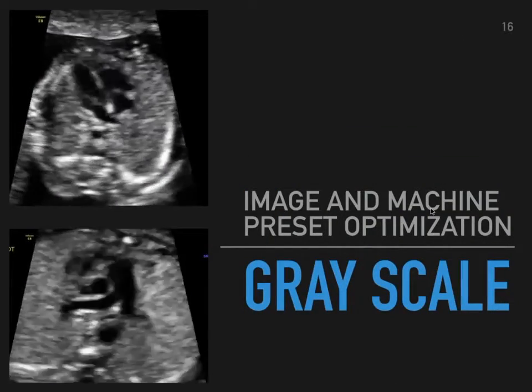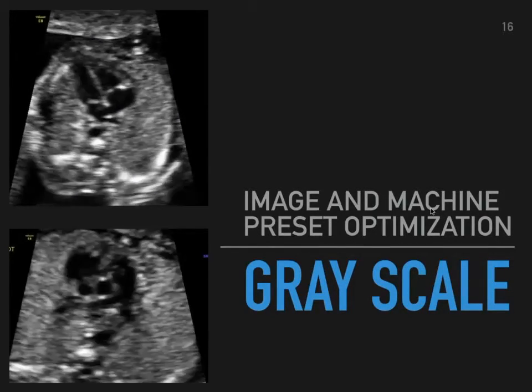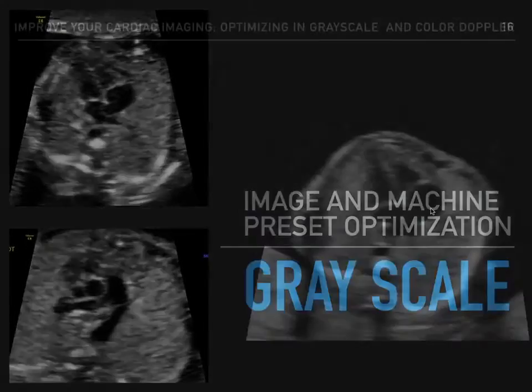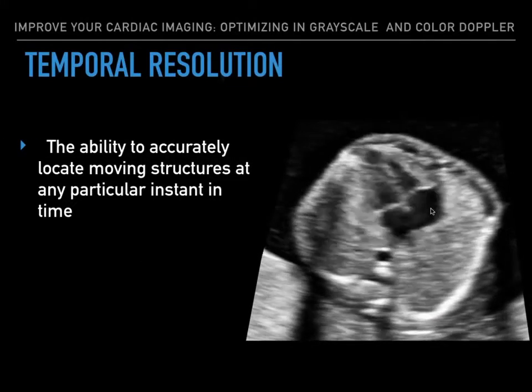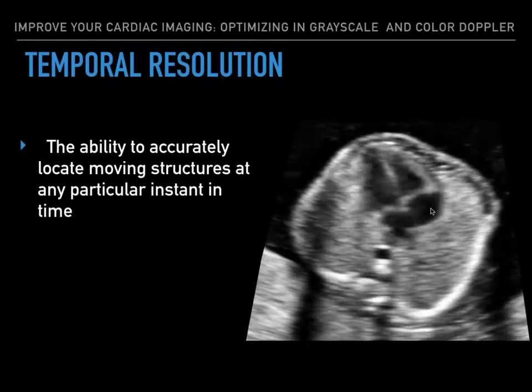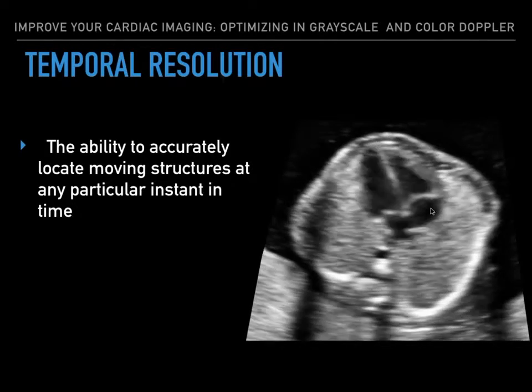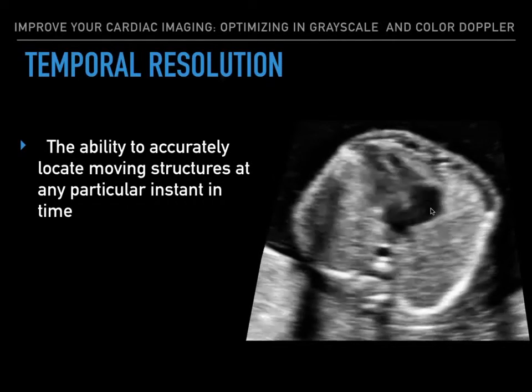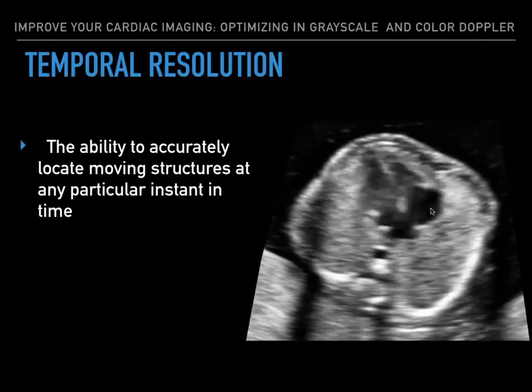Image and machine preset optimization. Just understanding your knobs and how they affect your image. One of the factors that plays a big role in 2D image optimization is temporal resolution. Temporal resolution is the ability to accurately locate moving structures at any particular instant in time. And what do fetuses do? They are constantly moving all the time, especially fast-moving structures like the heart.